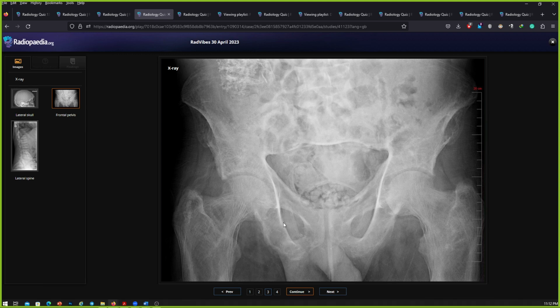And you referred to something being a calcified transplant kidney. Could you point that out to us? Yes, this one. Okay, so what is your final diagnosis combining the findings in the bone scan as well as these three radiographs?